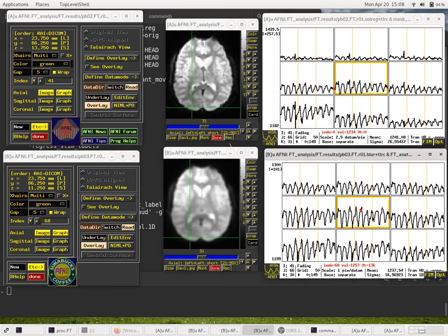And then looking at the time series, of course the time series will change a bit because you're blurring, you're adding in contributions from the neighboring voxel centers. So these time series look much cleaner right here than the ones above. We are in the exact same place in the brain. It's just that at each voxel we took the original one, and we have contributions from all the neighbors, given the Gaussian blurring kernel.